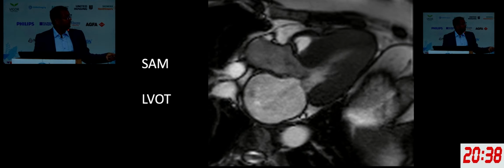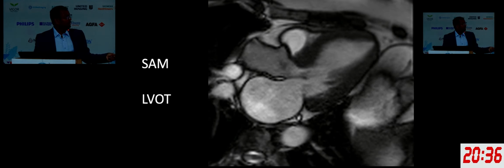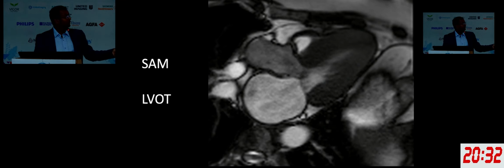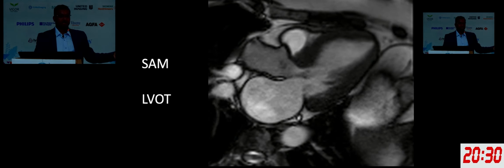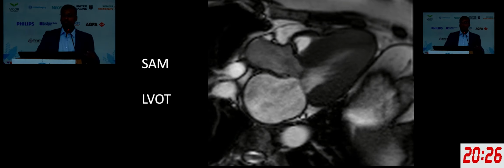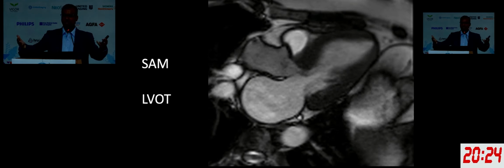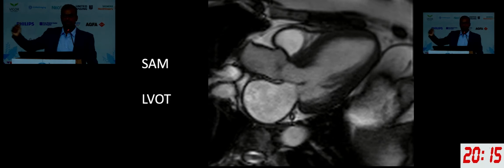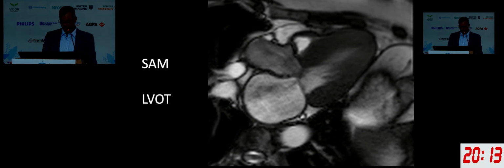It is very important not to miss a finding like this, where you see the mitral leaflet go in and block the LVOT, and this is what leads to sudden cardiac death in these patients. So this is SAM. Do not mention SAM in your reports as just SAM because it also means subaortic membrane for cardiologists. So do put the full form: systolic anterior motion of the mitral valve leaflets.